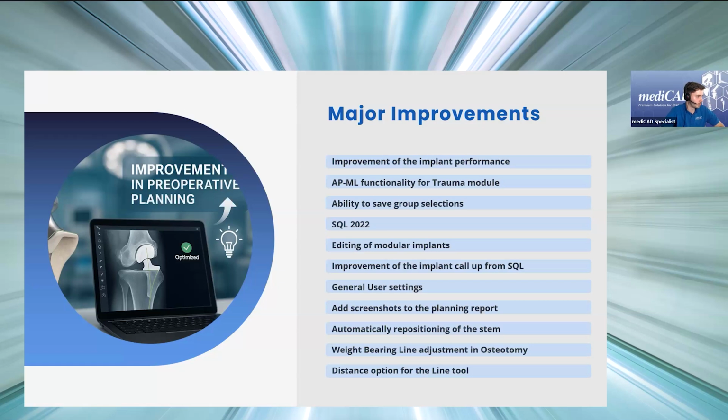If you obviously want to have the new database in SQL 2022, you just select this component in the setup, and then after that, it will automatically install, and the new PV will also automatically install in the new SQL. A lot more technical improvements have been made. Generally improved the implant performance and also how these implants are called up from SQL, just to guarantee an even smoother planning than we had before.